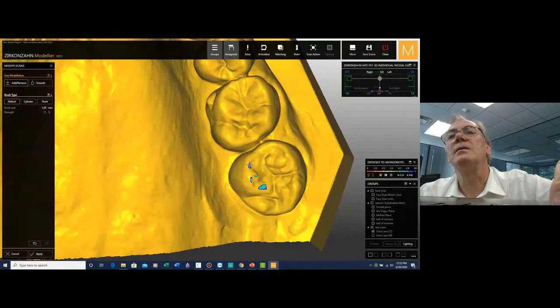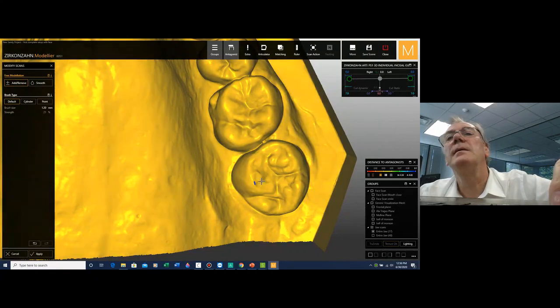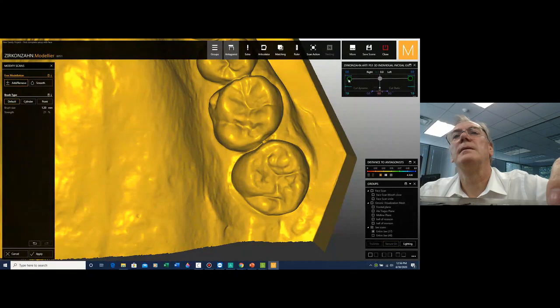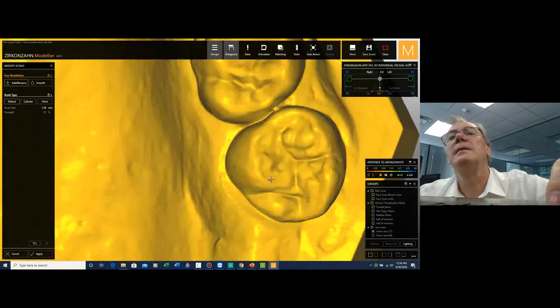Seems like this whole cusp needs to be, the whole cusp, we need to change the angle. I think we're good.